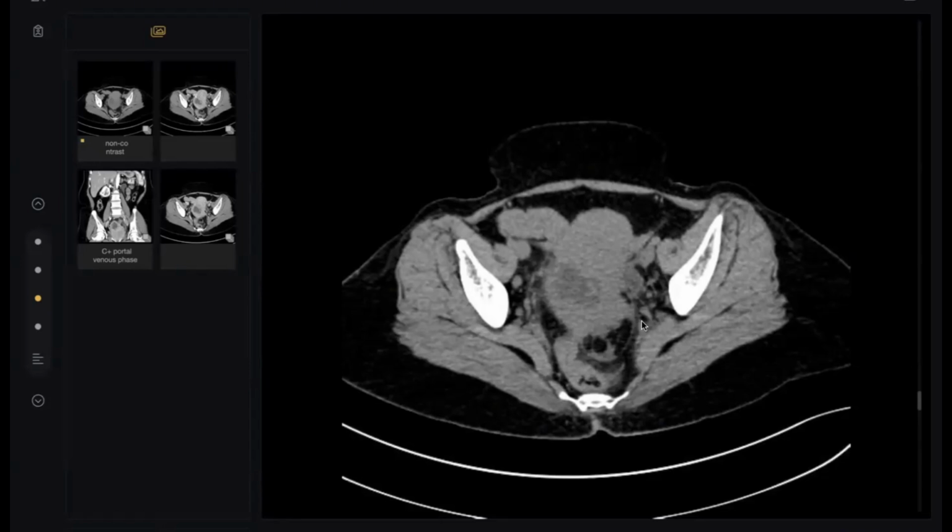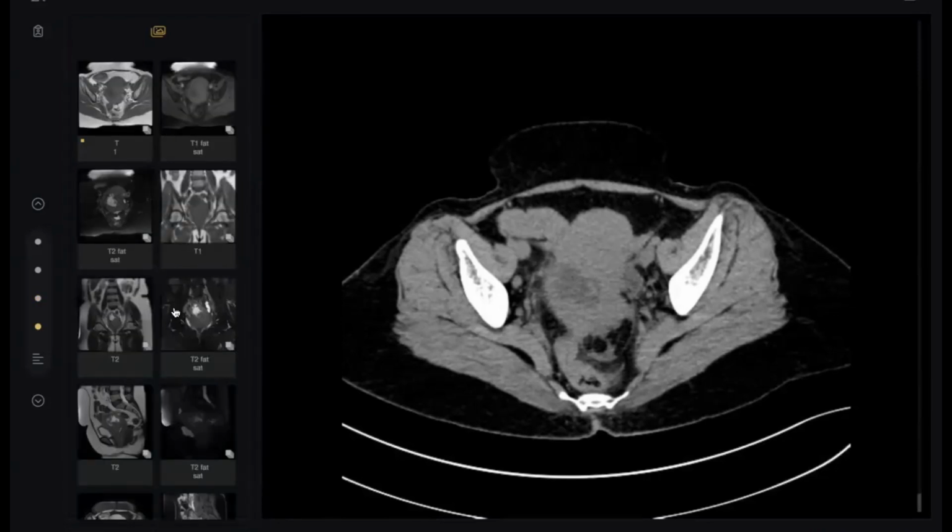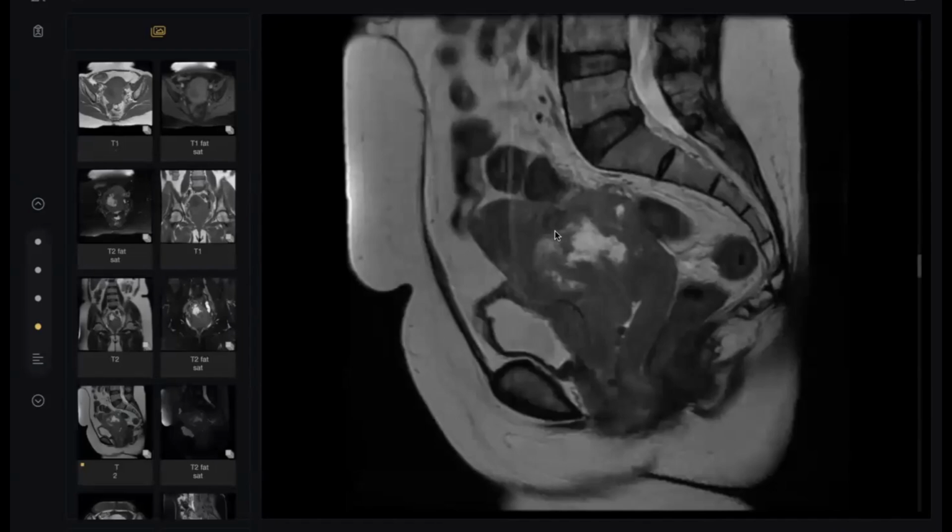It is a very common lesion in the uterus, very common to be associated with hydronephrosis. The only mass that can cause hydronephrosis. Okay, in the uterus. So a uterine leiomyosarcoma or uterine leiomyoma, but that's the fibroid, isn't it? What do you think?